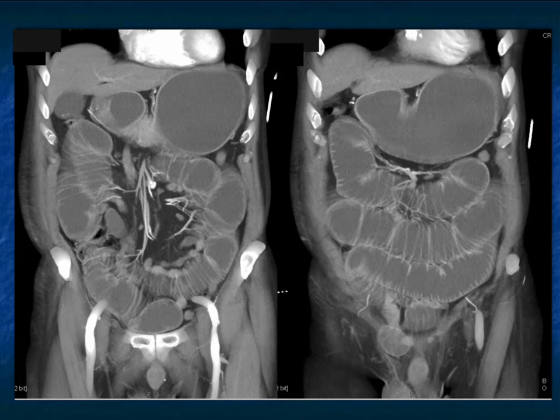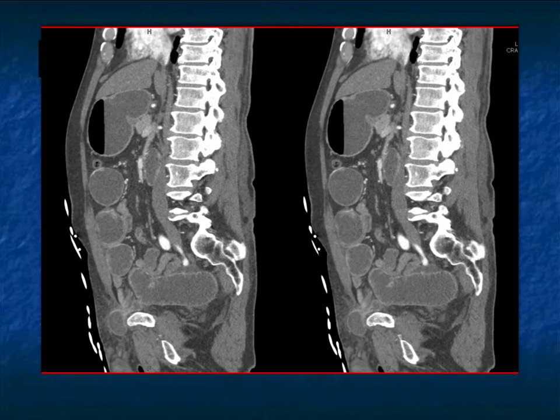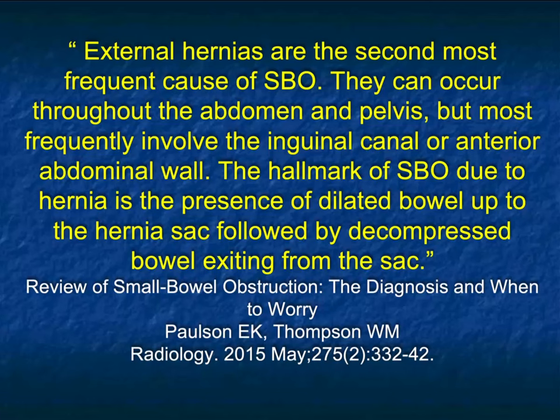We see the mesenteric vessels are patent, though branches off the SMA, the vasa recta, are a bit dilated. There's prominent mucosal enhancement of the small bowel, but it's a really nice example of a classic inguinal hernia. And here it is very nicely shown on the sagittal view as well. Again, making the point that I like to follow obstruction downward interactively, but that the coronal views are especially valuable. But in this case, the sagittal is also helpful.